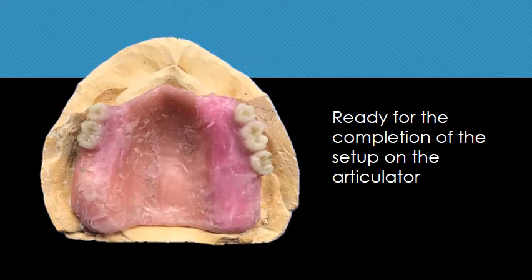The posterior teeth have been previously tried in to confirm centric along with confirming the OVD. So the case is now ready to complete by setting up the remaining anterior teeth so that the case can be processed.